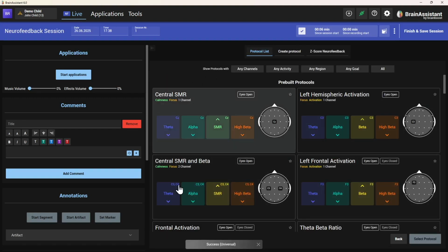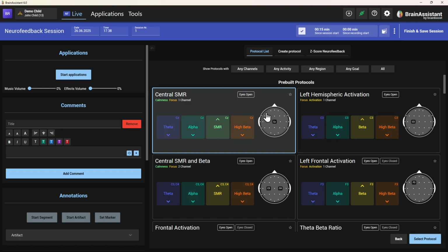So this is a view you're all used to, so we can train with amplitudes or frequencies, so frequency bands. Now, I can, of course, say a person with a high lack of concentration, so focus problems, will probably have a lot of theta, maybe alpha activity. If somebody is in a very stressful situation, you will have a lot of high beta. So I want to train this, inhibit or reward this, depending on what I want to train. So here I know exactly what the absolute level of theta is. Is it 18 microvolts, or how far is it increasing, decreasing?